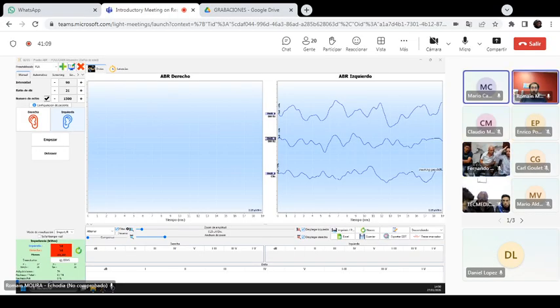If I'm activating the bone conduction, I can move through the requested range. So I think that should be enough to allow them to open the audiometry page and then show them that all these configurations are available.